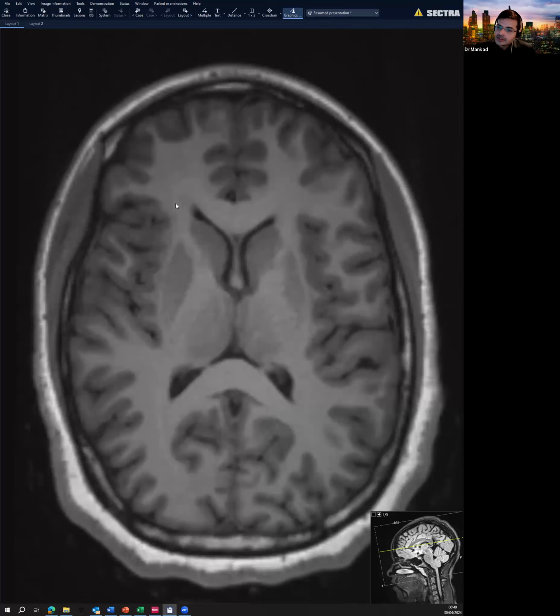So here we go. This is the white matter appearing bright compared to the previous sequence. The CSF is looking dark, and your gray matter actually appears like gray matter. It is dark gray. So cortical gray matter, as well as your caudate, the putamen, the thalamic nuclei, most of them appearing dark compared to the white matter. So what is this sequence?